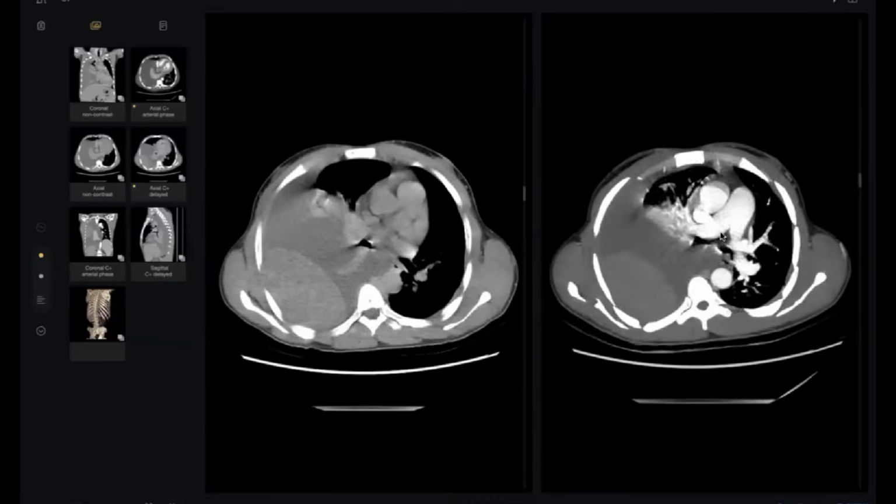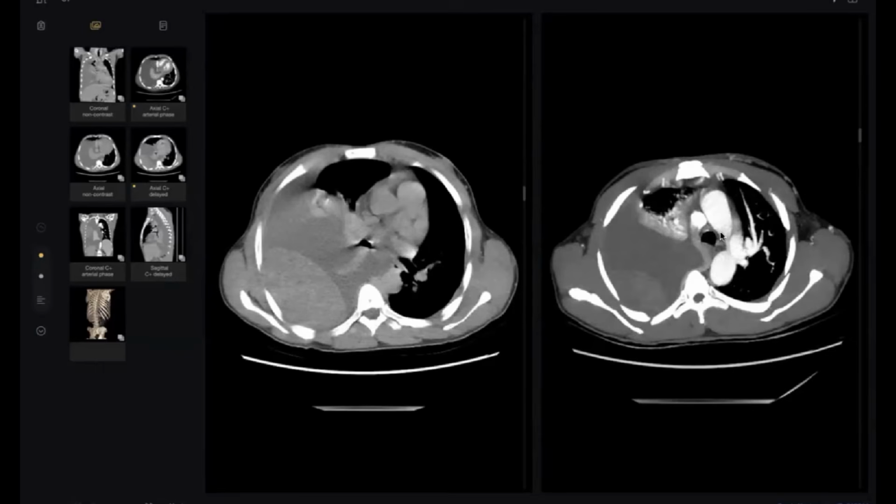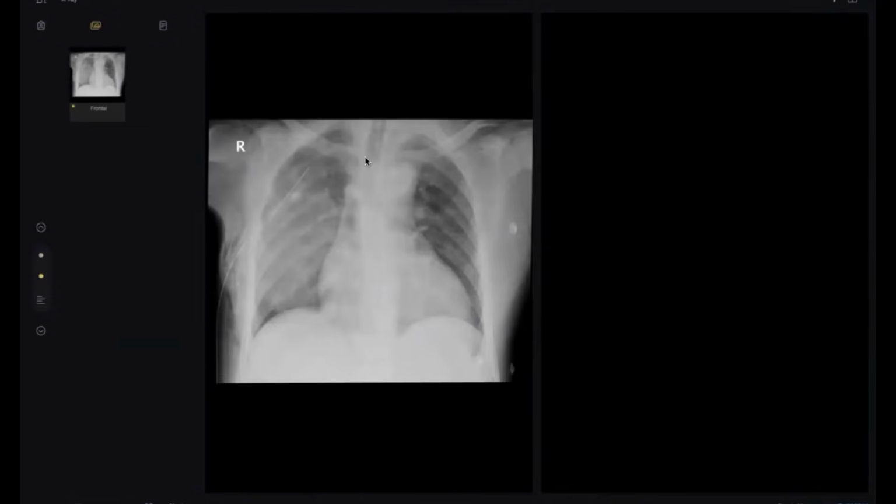And also for lung nodules, when you are in lung window, if you want to pick up any small nodule, change to the MIP. And the MIP has many options in the thickness, but at least you must know the cause, the image. Look here.